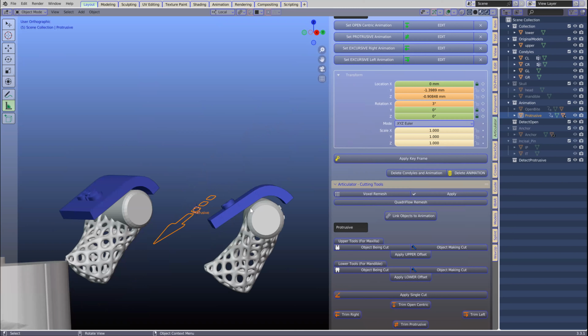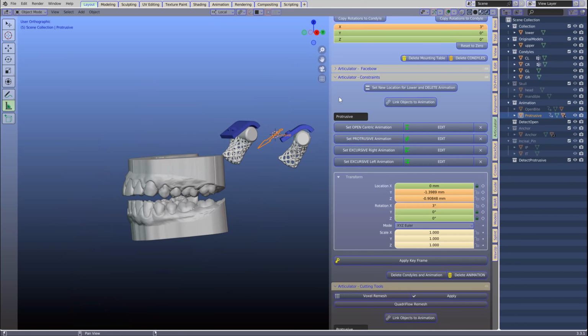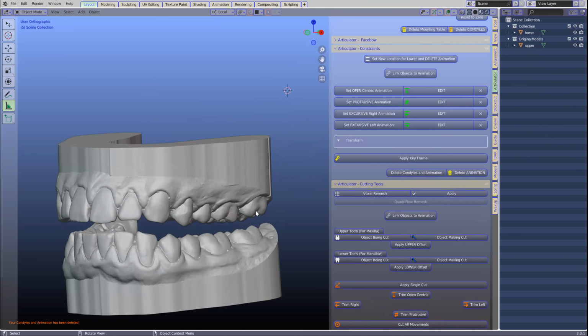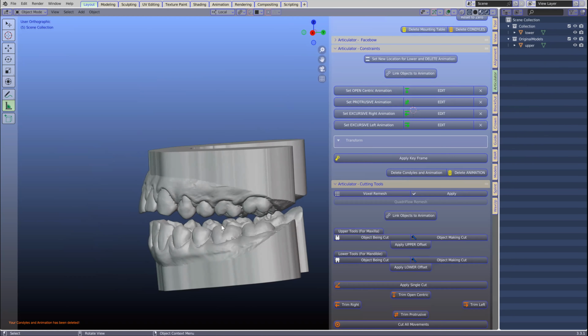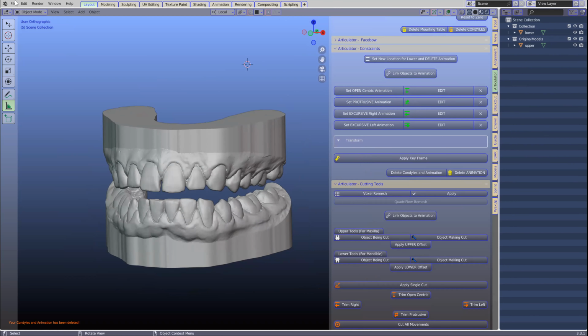I've got to put more increments into this to help you out, and we've set it to a certain location. Now we're going to set this new location for the lower, which means we've opened the articulator, no animation to it, it's just open. And we're going to delete the condyles. So this is what you wanted: open and moved forward, which we have. Now we want to engage in making the splint. Let me just save this.